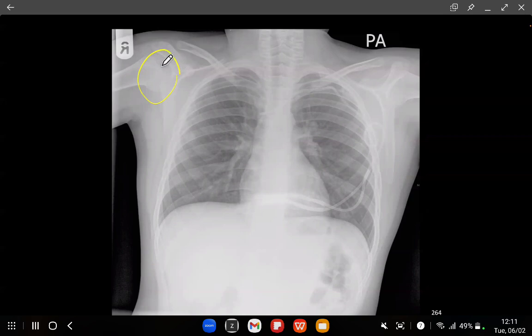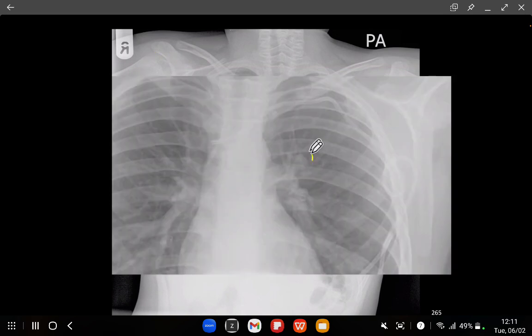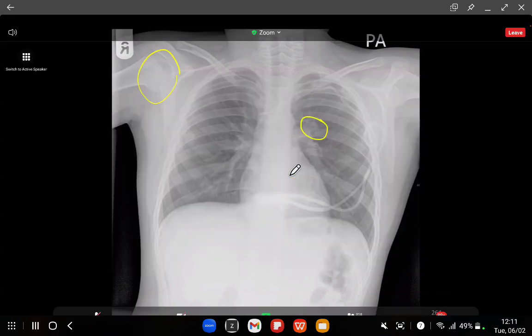So we've got a young patient, we've got what looks like a tunneled line, and we've got a nodule just there. There's the nodule. So put it all together. So why has somebody got a tunneled line? Yeah, it's a metastasis from an osteosarcoma. Okay, now it could be from anything that gives you cannonball lesions, but it just happened to be an osteosarcoma.